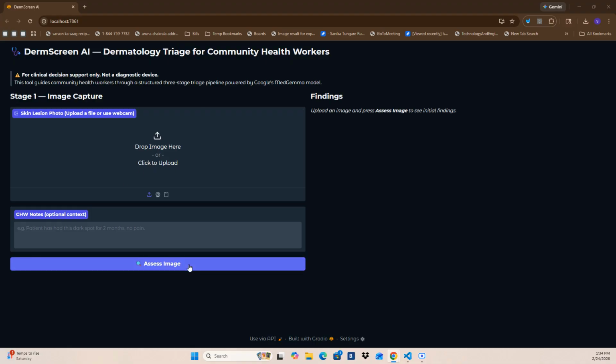And it will access your image, whatever you're putting in via a phone or browser. That is the first stage. Then it gives you the findings, what has happened, the basic findings. It asks follow-up questions and also gives recommendations along with them. Let's see how it works.